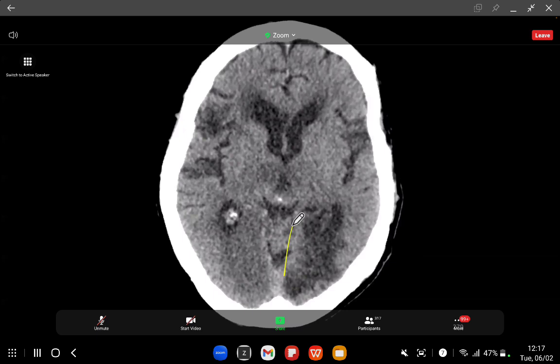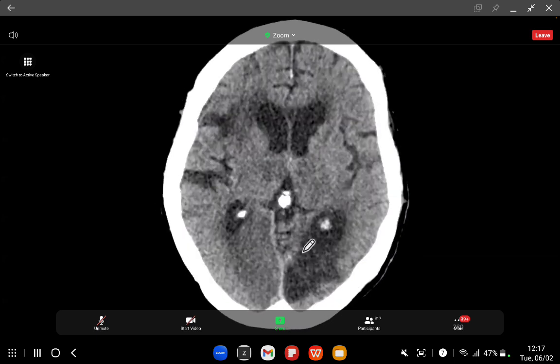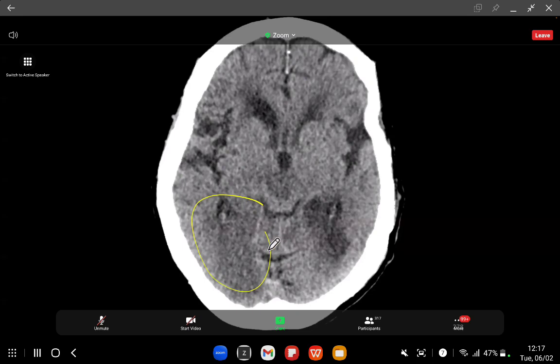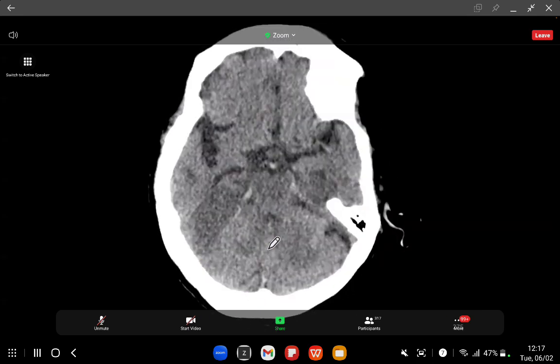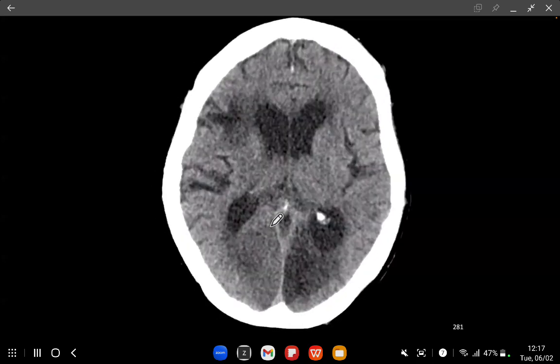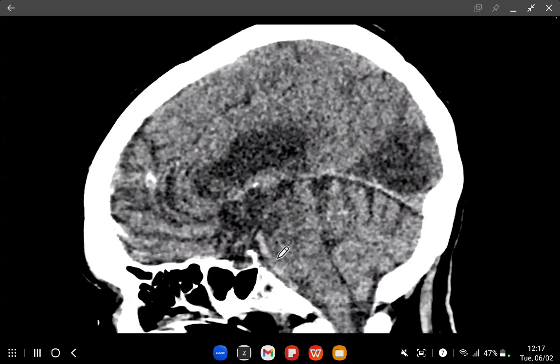Okay, patient had an old infarct in the past with ex vacuo dilatation of the ventricle, and they've got an occipital infarct now, so they're going to get cortical blindness. Now, whether or not it's worth doing a mechanical thrombectomy can't be decided just on the radiology alone. You've got to have a discussion with the clinicians and the interventional radiologists concerned. Okay.